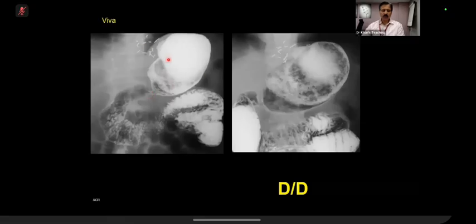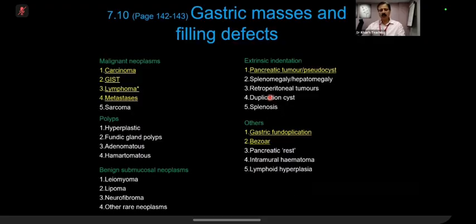These surgical clips, in that era when they used to do these kinds of surgeries, they used to do what we call partial or selective vagotomy. So the vagus nerve or its branches were also cut. So this is that evidence. With that, you can see this mass. This mass has got a mottled, bubbly appearance. The key thing is it's mobile. It is moving inside. When you see this bizarre kind of appearance, the only thing which comes to your mind is a bezoar.